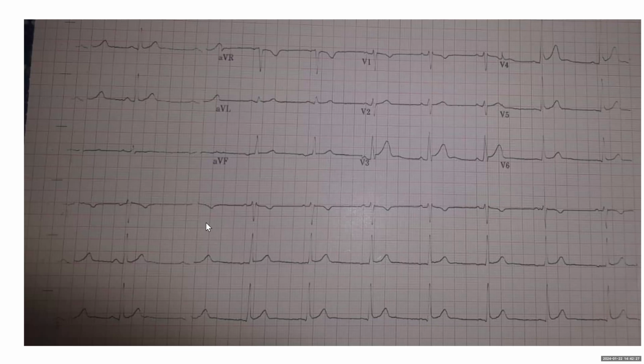So this RR interval is longer than this, but the P wave morphology is similar. So this is what we talked about, the sinus arrhythmia. And then you have to add one more code. I think it's fair to add pericarditis, but in real life, this is probably not pericarditis. But I think it's okay for the code.